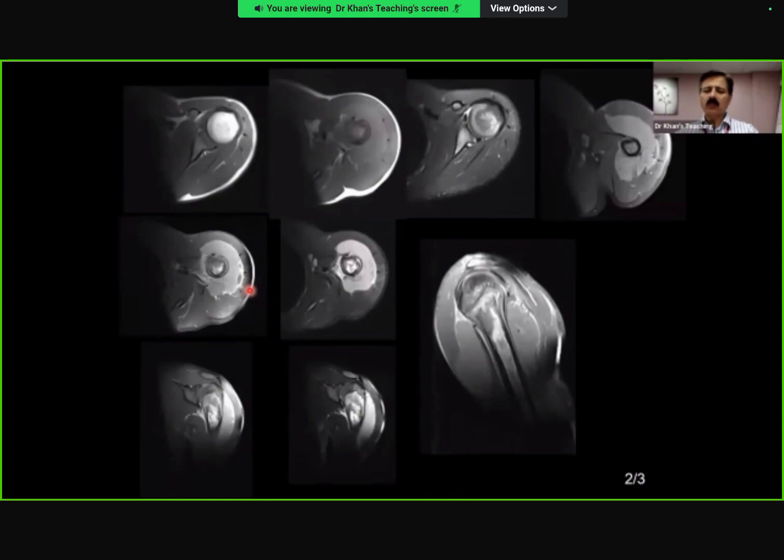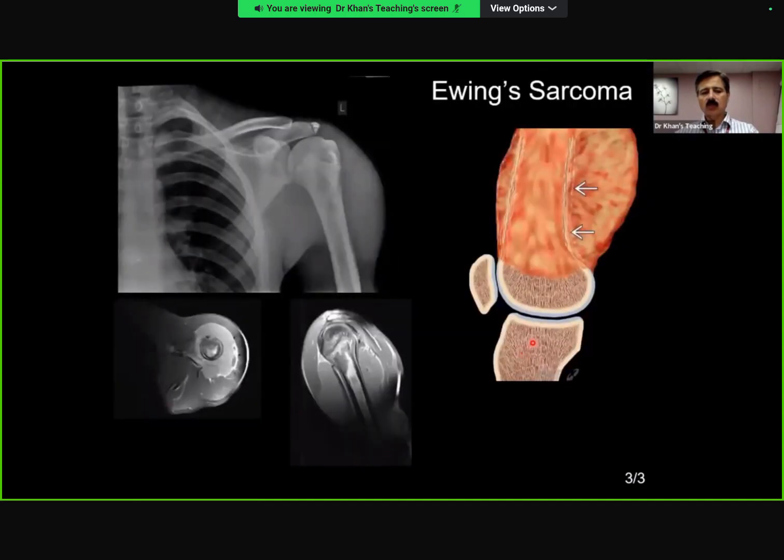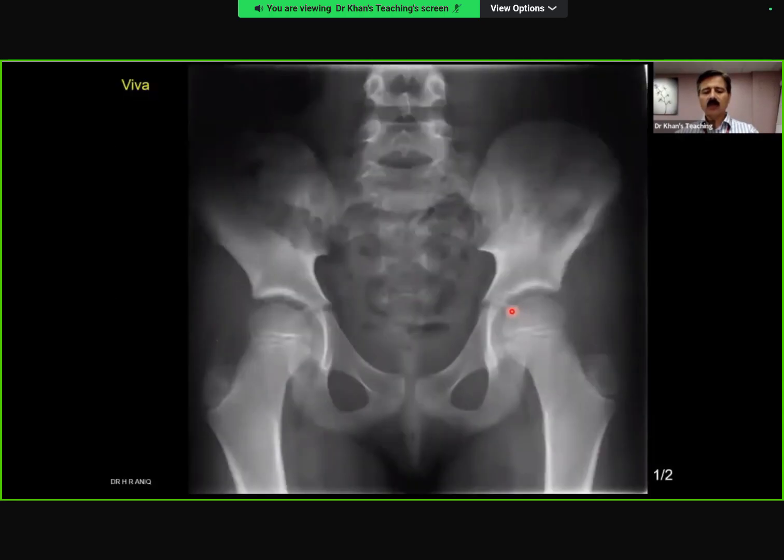Number two, lymphomas in this age group with this kind of radiology are much rarer. Out of 100 cases, maybe 5 of them might be lymphomas. But radiologically speaking, yes, lymphoma can be kept in the differential with this fine print that the soft tissue might not be as much. So this is classical Ewing sarcoma, and this picture also tells you what happens.